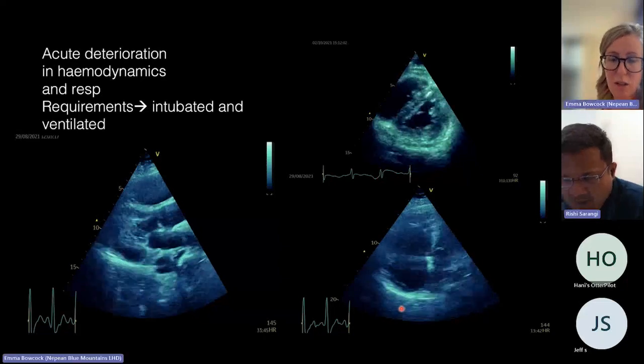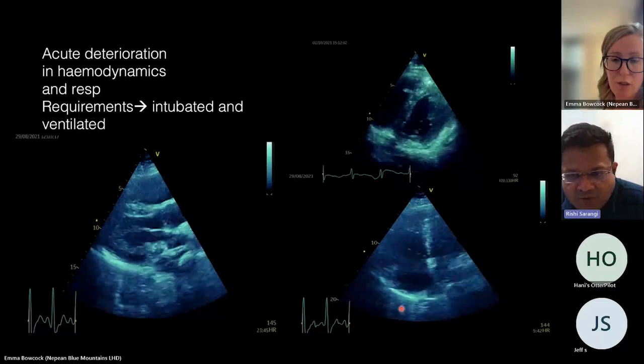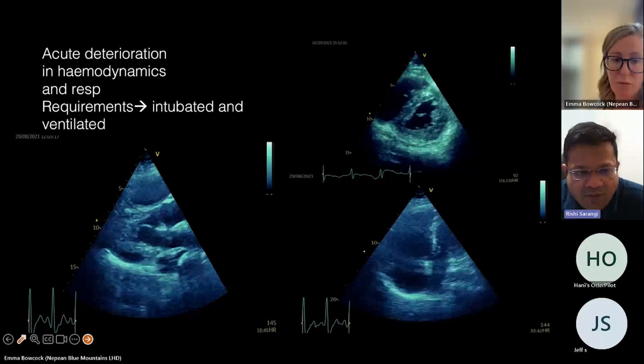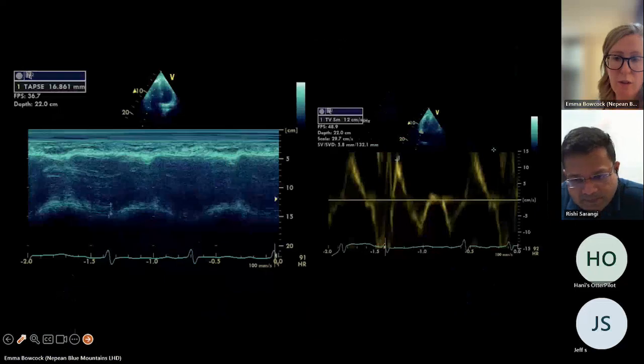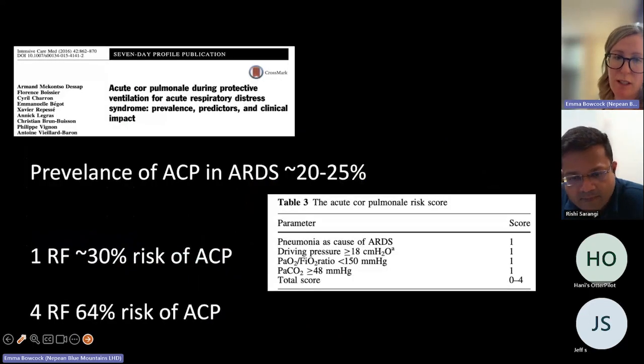Yeah, nice. But again, the wobbly rocking movement of the heart is also pointing towards severe RV pressure and volume overload, very related to the ARDS. Very nice. So the TAPSE was just a little bit down or normal, and the S prime was normal, lower end of normal.